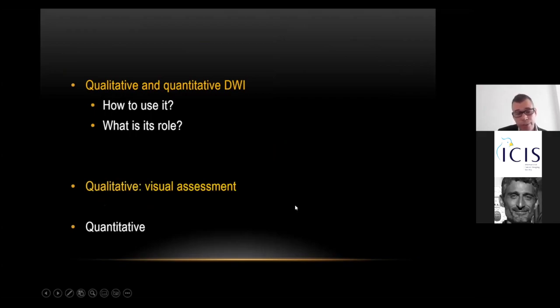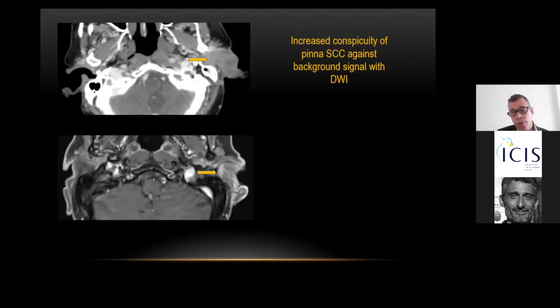I'll try and provide some tips with qualitative analysis, and we'll also go through a little bit of the literature with quantitative analysis. So what about just looking at our diffusion-weighted imaging? How can we benefit from this?